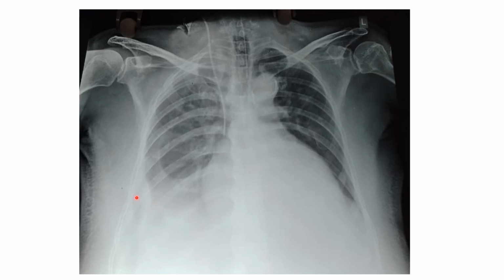So here we have a right-sided pleural effusion. The costophrenic angle is blunted and the cardiophrenic angle is also blunted, and then you have a diffuse haziness throughout the lung field, right? So probably this X-ray is taken in the supine position, and you can also see that this haziness is more on this side and this lung margin is up here. The lung is floating in fluid and when you lie supine, the fluid tends to go all the side and the lung is actually floating in that fluid. So you can see a distinct mark up here, right?